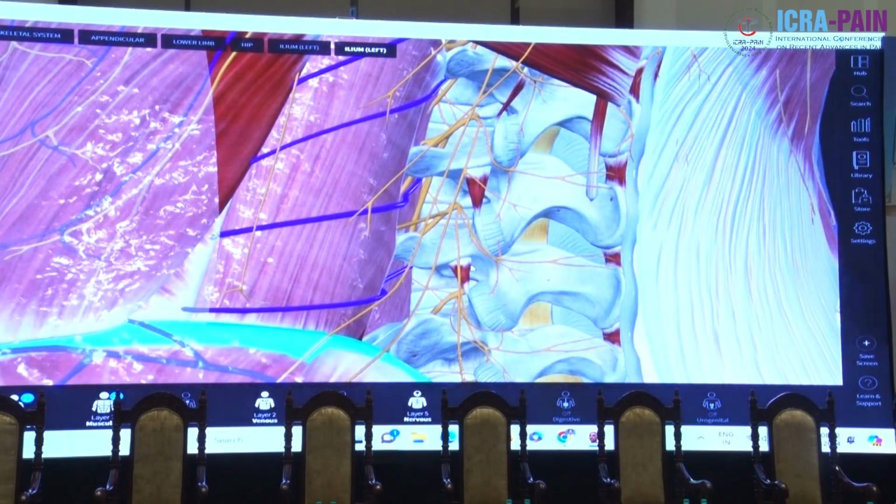Okay, so let us go a little deeper. The thoracolumbar fascia we have discussed. The thoracolumbar fascia is splitting. If you are going above, then it is splitting between the posterior layer of the thoracolumbar fascia and the deep fascia. In between these two there is a muscle known as, what is between this thoracolumbar fascia and the deep fascia? Latissimus dorsi, most superficial.